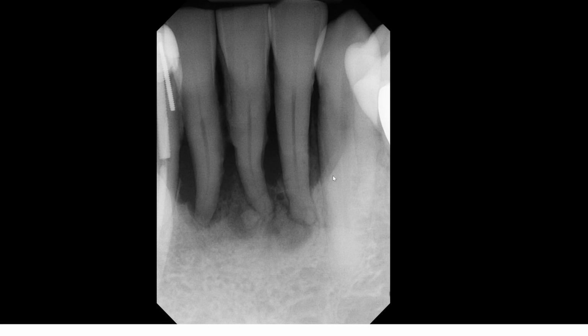So now I have pulled a periapical radiograph of this area, once again, number 23 and 24. And we can better visualize the details of this area absolutely much better than the previous panoramic radiograph, right? Here, now we can distinctly visualize two separate periapical cemento-osseous dysplasias.